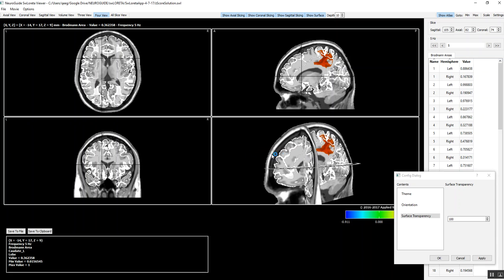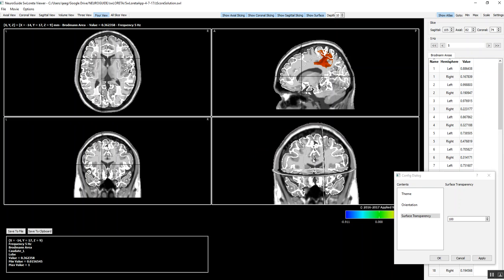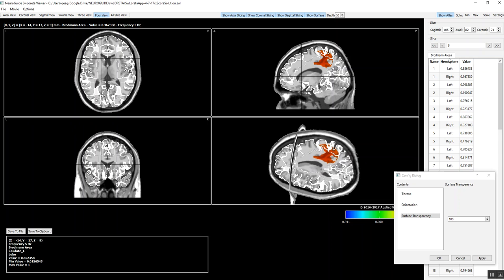And now when we look at the planes, you see the volume itself is gone, and all there is are the images. In this case, this is the coronal plane, same as this one. Here is the axial plane, which is the same as this one. And of course, here's the sagittal plane, which is the same as the one right up above here. It's this one. By removing the volume, you can get more detail this way in 3 dimensions.